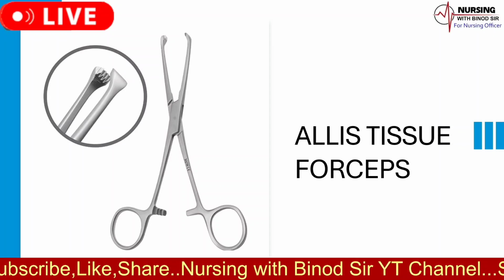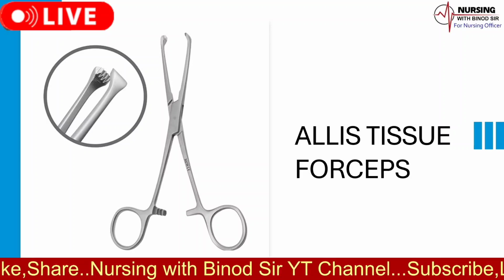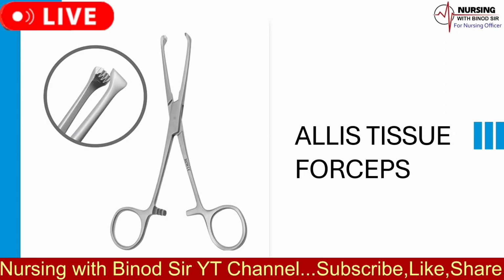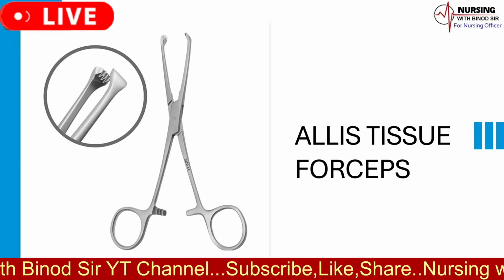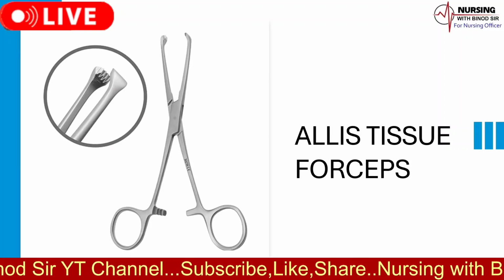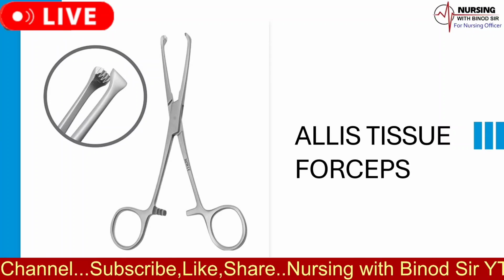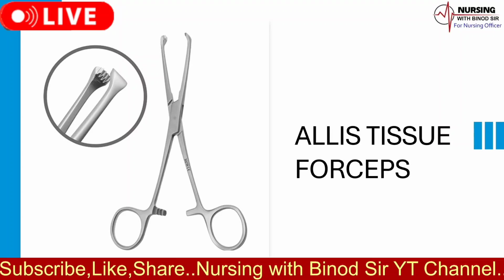The name of the instrument is Allis tissue forceps. The uses of Allis tissue forceps are as follows. 1. To catch hold of the anterior lip of the cervix in D plus E operation. 2. To hold the apex of the episiotomy wound during repair. 3. To catch hold of the margins of the peritoneum, rectus sheath, vaginal mucosa during repair.